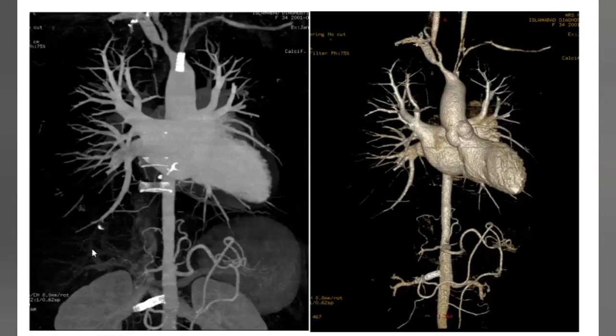So what is your diagnosis now? Takayasu arteritis. Exactly, great. So any differential that you have in mind? Sir, other vasculitis? Such as? Sir, great vessel, giant cell arteritis, atherosclerosis. Like the other diagnoses are involving the middle and small sized vessels, like polyarteritis nodosa, Kawasaki disease. So I think Takayasu is fair enough.